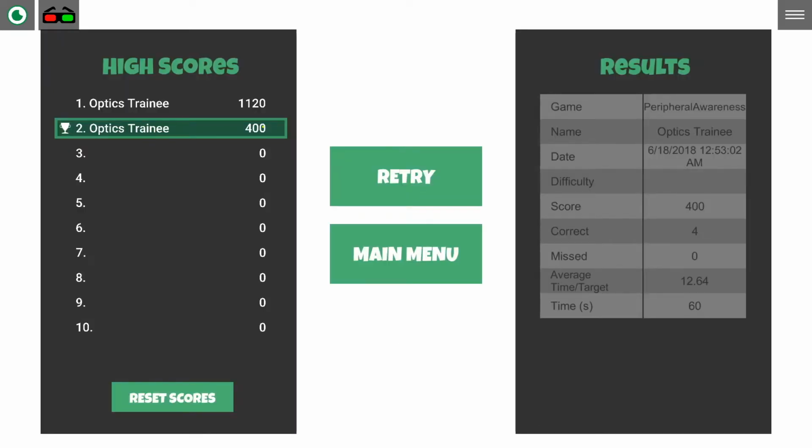And one thing to note is that you can still press the letter as long as you've seen it. Make sure when the user's hands are reaching out to touch the screen, they don't obscure the sensor on the bottom. This might prevent the tracker from tracking accurately. So just be careful of that.